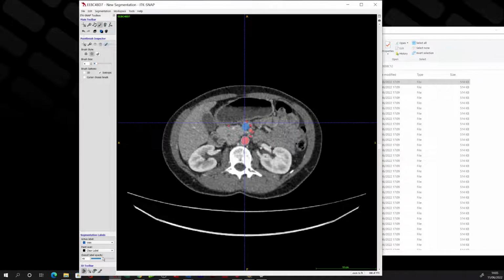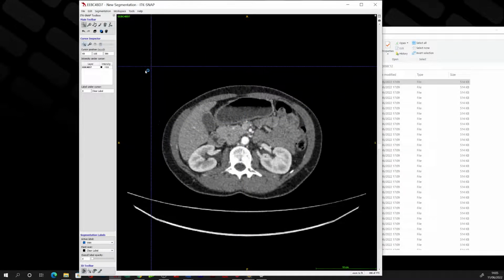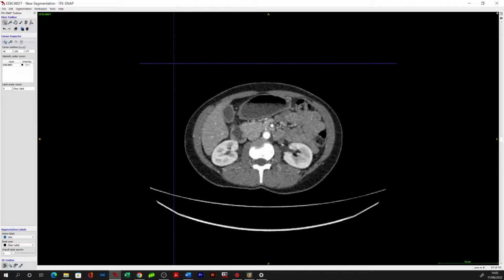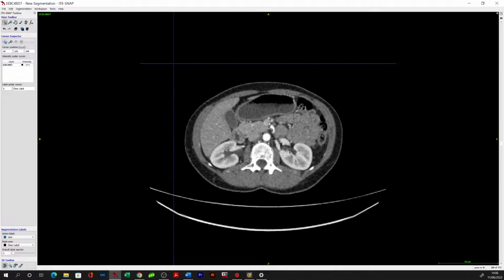So this is where sometimes it's useful to take away. I don't know if you'll believe me or whether you can make this out, but you've got the SMV here, and then, look, it's this MCV that's coming off anteriorly and then passing to the right. We can make an educated guess that this is indeed the MCV, because it is running along with the artery, which is what you'd expect anatomically.